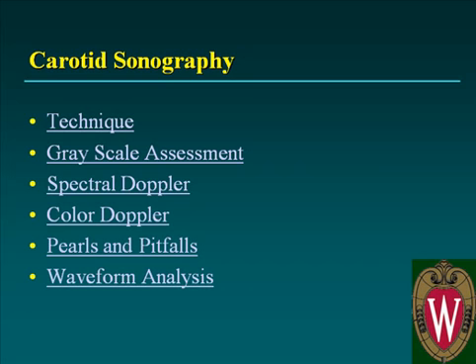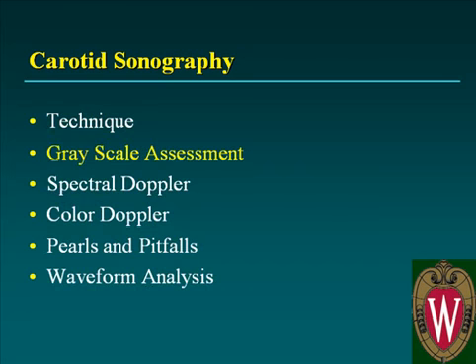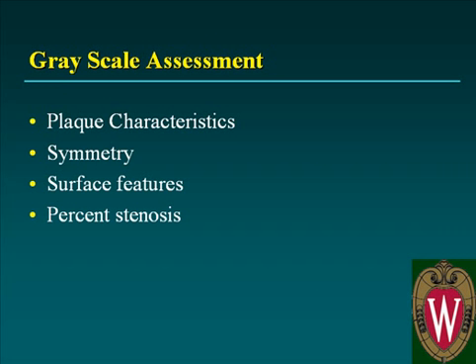The grayscale assessment hinges on several things. One is, what are the plaque characteristics? What's the symmetry of the plaque? What are some of the surface features of the plaque? And then finally, percent stenosis.